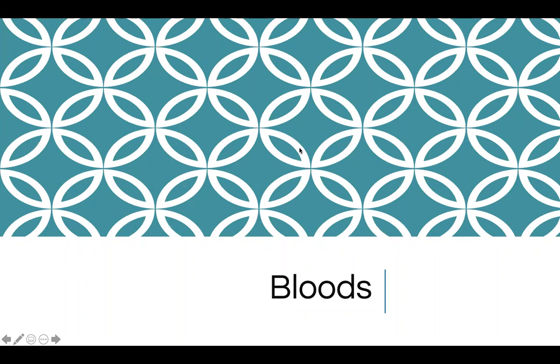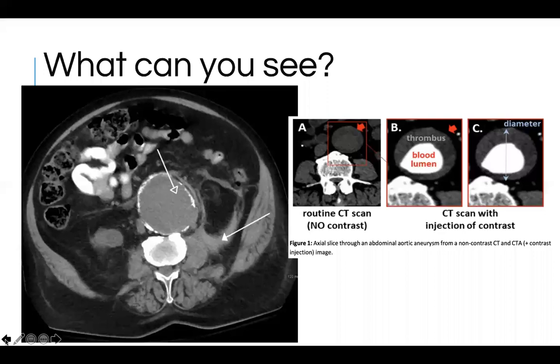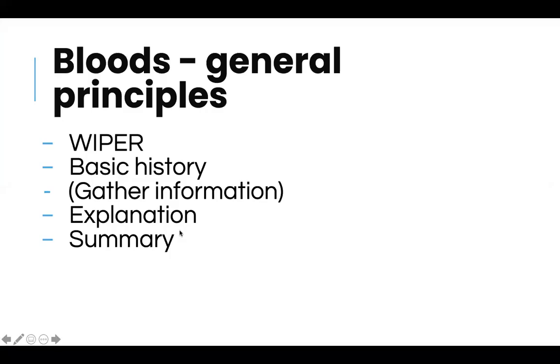Thank you, Urissa. I've just noticed that Rahul was asked, could you outline the false lumen in the previous image? My interpretation of a false lumen is that there is a secondary pathway where the blood can flow through. Yeah. So usually if there's a false lumen, you'll see that light up as well. And there'll be a delineating area between both, depicting the vessel wall between the two lumens, if that makes sense. Yep. Okay. Great.